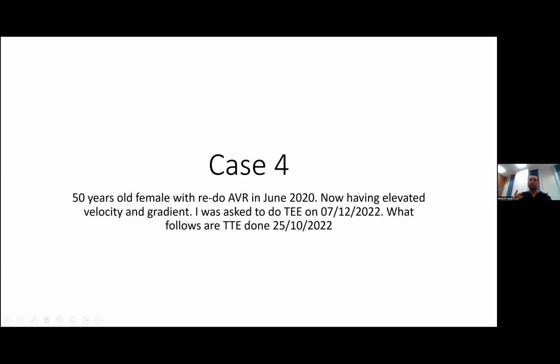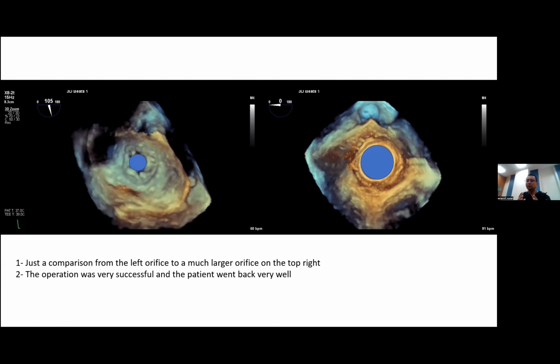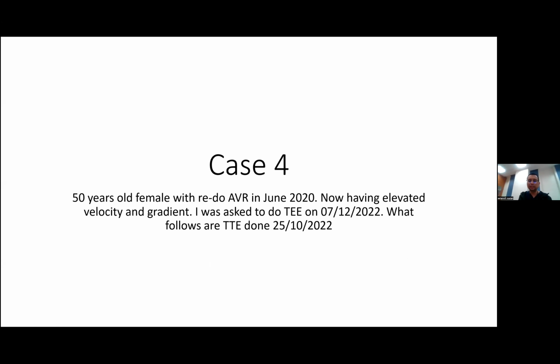So I just wanted to tell you, sometimes when you're dealing with congenital heart disease, especially adult congenital heart disease, you have to be very careful in analyzing the echo images. Okay, if you're wrong, you might just say that the problem is the leaflet tips with area of 1.5 centimeters squared. You might ask to do funny things like PTMC, the patient already has a ring, and then cause disaster. So just be very careful with someone that had a history of surgery before. Okay, that is our case number 3.